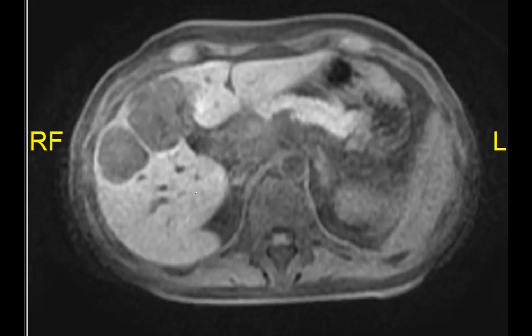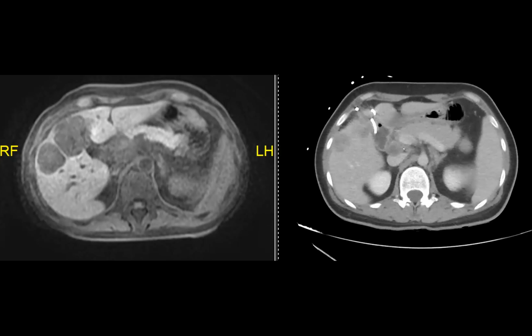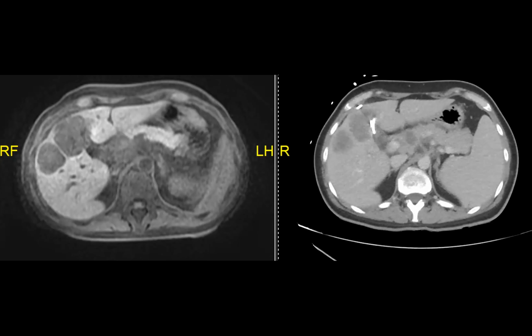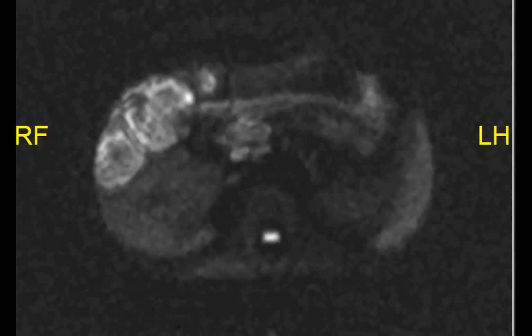So I guess the initial CT is understandable, although again, I would caution anybody who sees lymph nodes like this to be very careful about calling them reactive. But this is kind of reasonable, I guess. But once you get to MR, you have growing lesions. If I didn't tell you anything, didn't tell you his age or his presentation, you probably would start thinking cancer, cancer, cancer. But I think because of this kind of bias, they kept going down the same path. Anyway, this was proven to be gallbladder cancer.